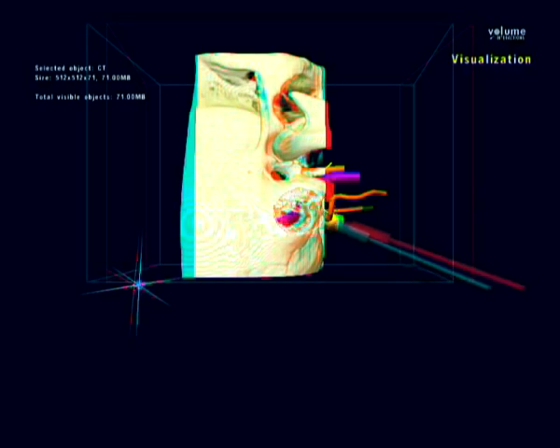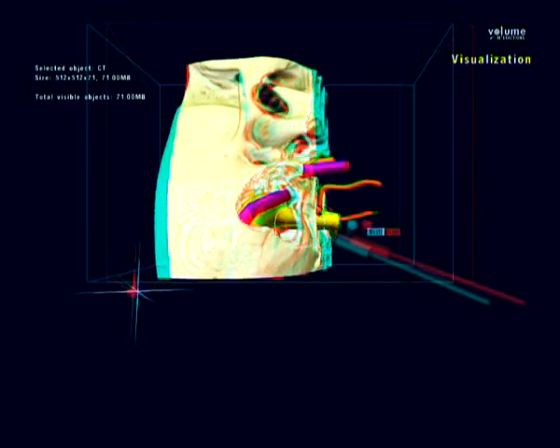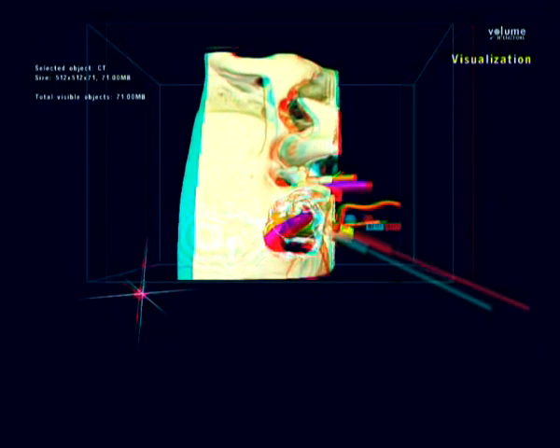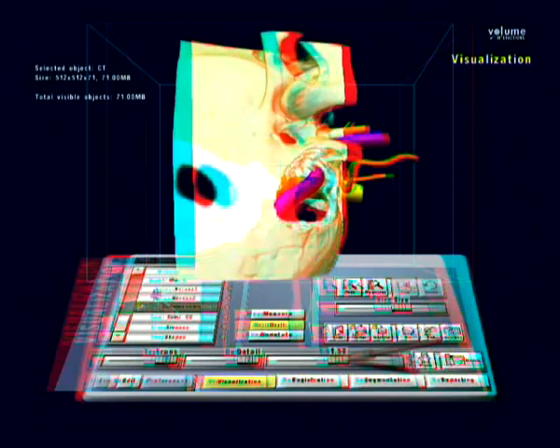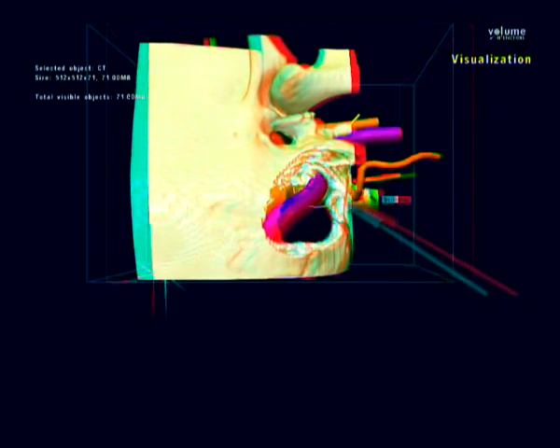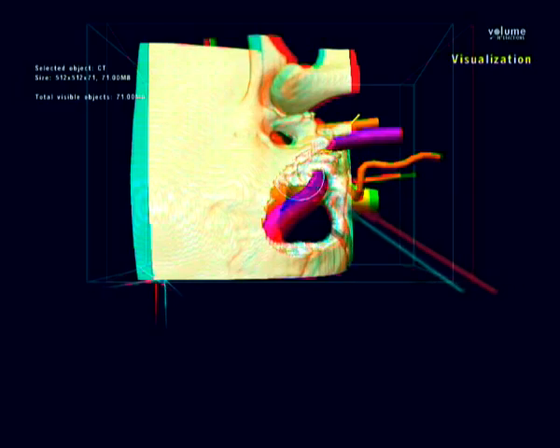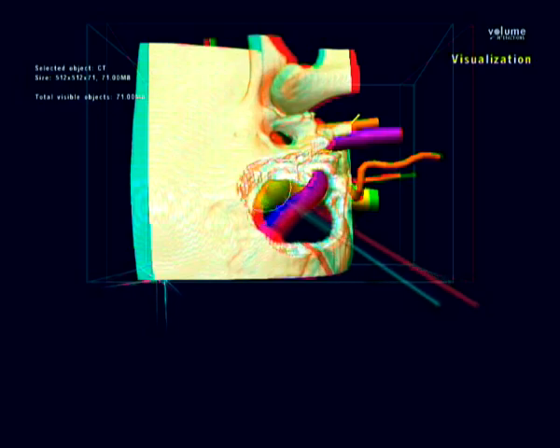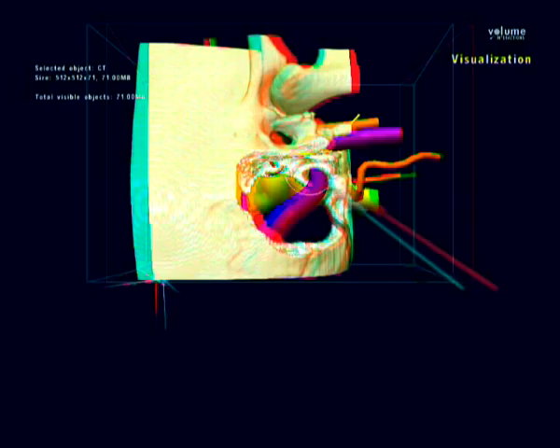For the infralabyrinthine approaches targeted around the jugular foramen, the Virtual Temporal Bone is now drilled in front and behind the sigmoid sinus. The tool rack at the bottom is used to magnify the image again. The petrous bone is now drilled to expose the semicircular canals and the facial nerve. In this exercise, these structures are left intact, although they can be mobilized if necessary.